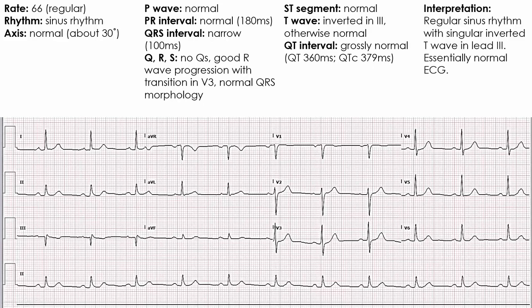Interpretation. This is a regular sinus rhythm with a singular inverted T wave in lead 3. This is essentially a normal ECG.